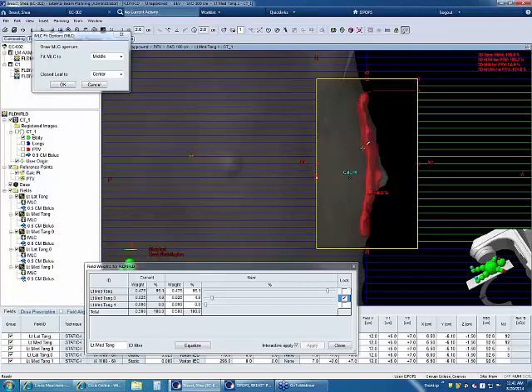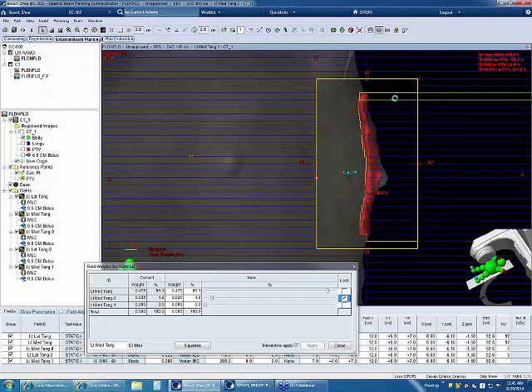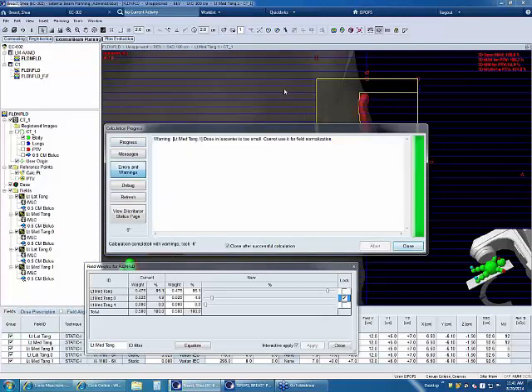This is doing good. One of the problems I used to have whenever we had chest walls or something like this was it was always really, really difficult to keep the hot dose down unless we did something like this. And now, of course, like I said, I can be sloppy. And then I can click inside here to set them and move one at a time and calculate my field again. Okay. Alrighty. And I'll close this.